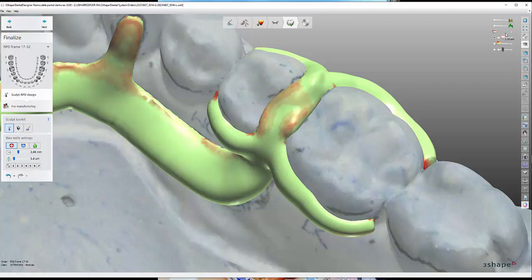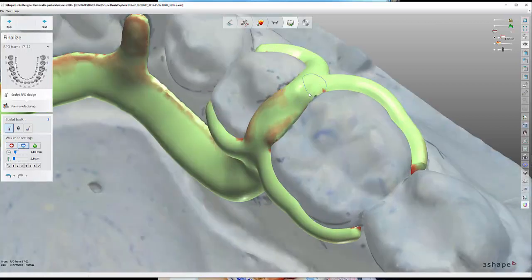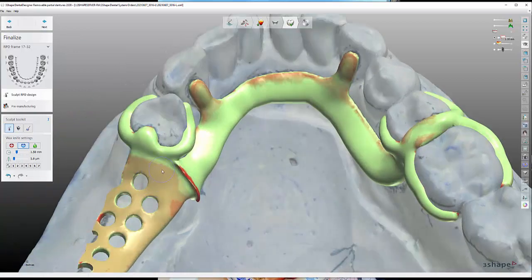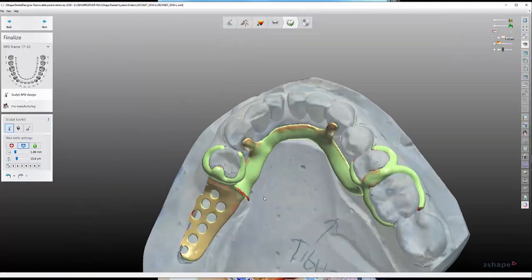And when we're looking at this, we're using our thickness map at 1 mil. So we're bringing these rests just below 1 mil, so you just have a little bit of barely seen red. And then I'm going to increase my intensity here and try to define the edge of that.